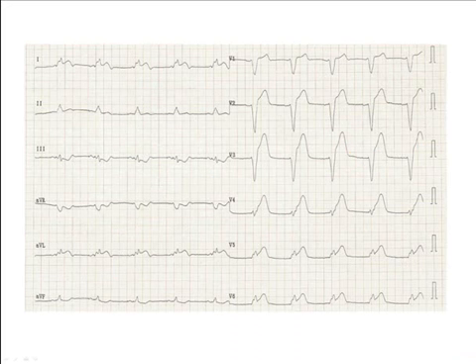These strips illustrate the value of the Sgarbossa criteria in determining the presence of an MI with a left bundle branch block. While these strips look ominous at first glance, a closer look would reveal that the QRS duration is delayed, which would cause you to look at V1. You see that the terminal complex is downward, which would indicate that this is a left bundle branch block.